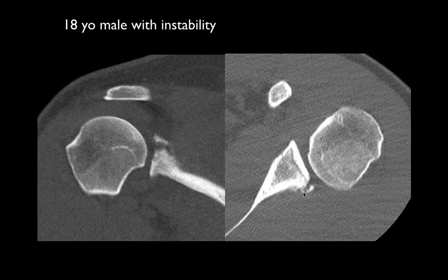So again, this is under the rubric of a Bennett lesion, which is really an injury to the soft tissues which attach back here, either the labrum and the periosteal attachment or the posterior band of the inferior glenohumeral ligament. And then when the body tries to heal that, you get calcification in that area of injury. Both are highly associated with posterior instability.